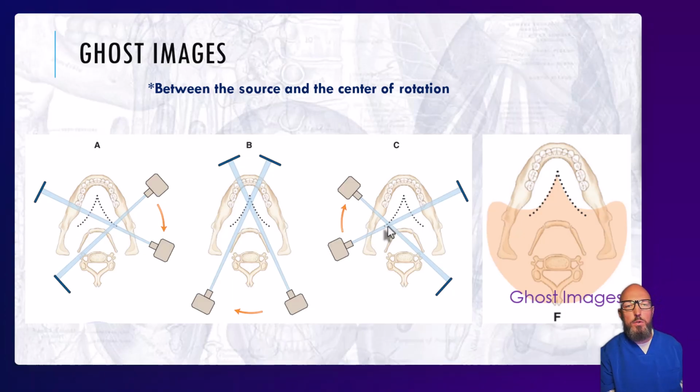So some other rules you need to know. First, the ghosts float, meaning X-rays are coming from below and they're projecting higher. So a ghost image is projected even higher on the opposite side. So ghosts are higher than the real object. The second thing is ghosts are blurred horizontally. So if you see something stretched out and not in focus, maybe suspect that that's a ghost image and not a real image.